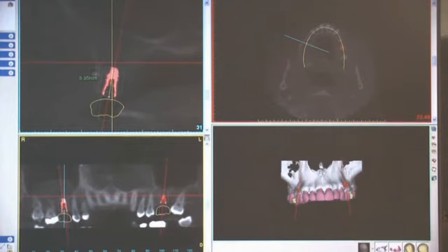Right, and it looks like you have a huge width here. The ring that is around the implant is 1.5 millimeters, so it looks like we've got well over 1.5 millimeters of bone surrounding that implant. So that looks like it's in pretty good shape.